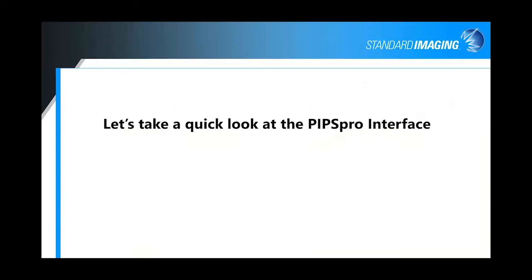So now I just want to give you a quick look at some of the tests we do for the software. I won't go through all of them. I just want to give you a taste of what the interface is like. If you do want to see the software more in depth, please feel free at the end of the talk. I'll have a couple of emails up there that you can send to our sales group. They can get a hold of me, or they can set up a time with you to do a more in-depth demonstration. But for the time being, let's take a look at the software.